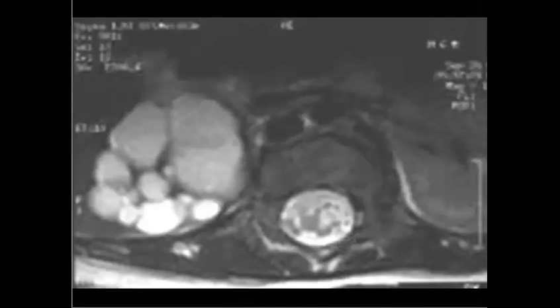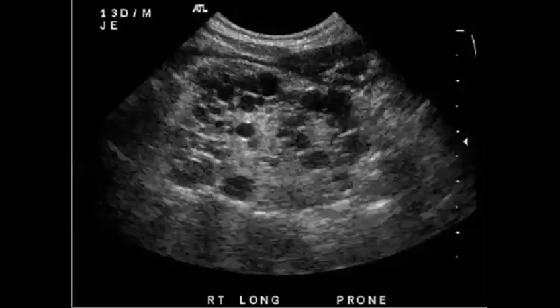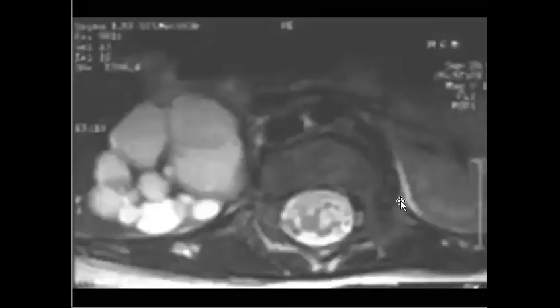Majida, welcome. So yeah, multicystic, but which multicystic one? It will be which multicystic? Yes. Perfect, doc. So this one is like a dysplasia. Yeah, a type of dysplasia that can happen in utero. Yes, it can be unilateral, but if it happens bilaterally, it would be incompatible with life. Perfect. Multicystic dysplastic kidney, when you find macroscopic cysts that are non-communicating together.